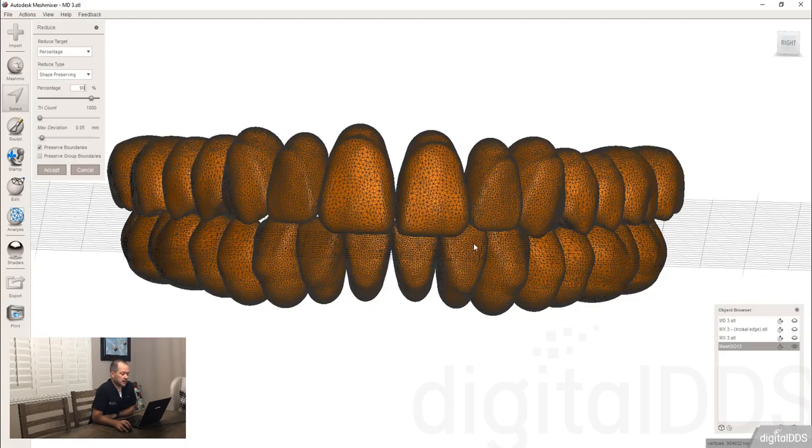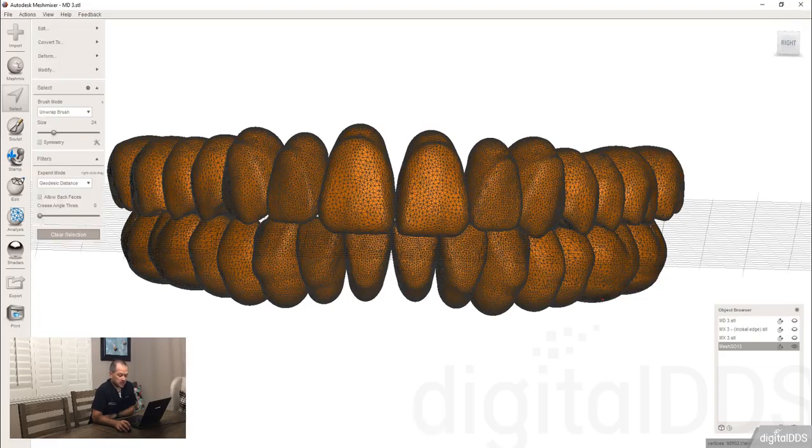That is something I'm much happier with. So I'm going to go ahead and hit accept. And I'm curious to see what this number down here turns to once we hit accept, because like I said, it's about 2 million right now. And I'd rather not mess around too much with our model. But if we were to want to reduce it, see, it dropped all the way down to almost 200,000. So it went from 2 million to 200,000.